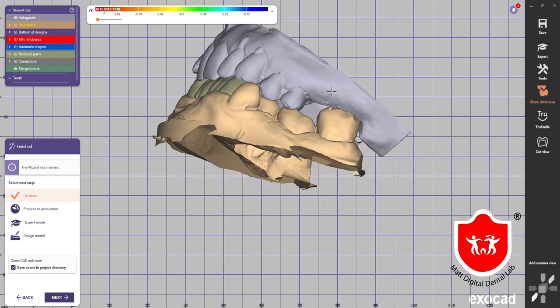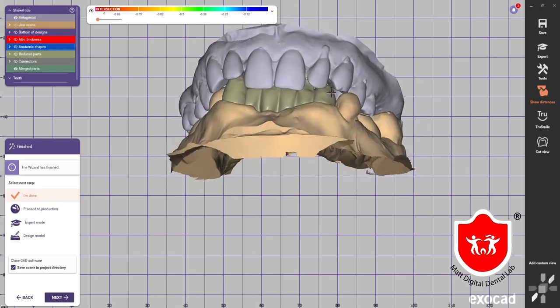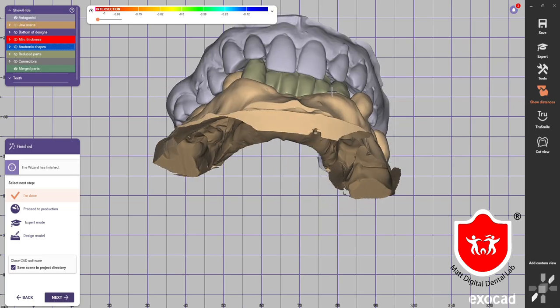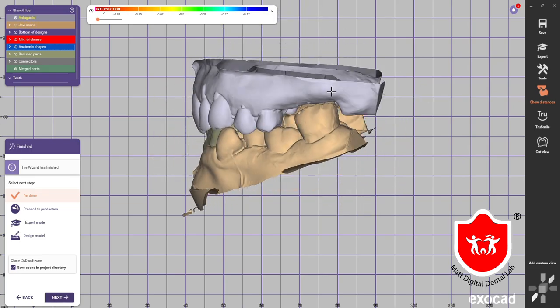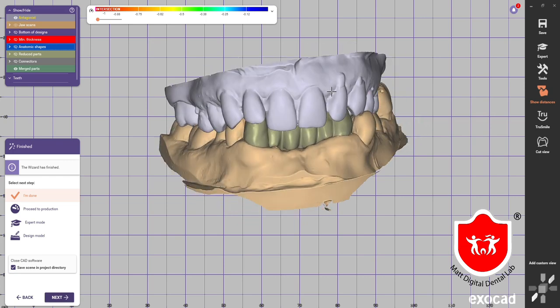So since it is a compromise case, we can't give more aesthetics right now. So after adding the ceramic and after finishing, it will look good.